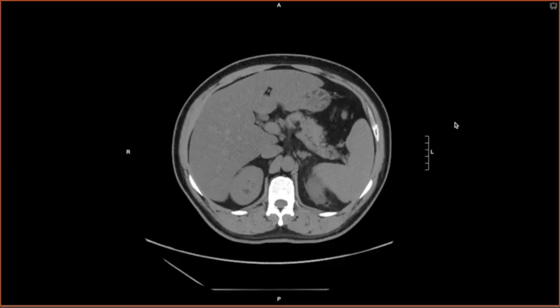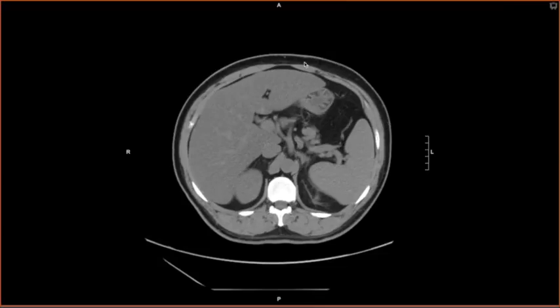Okay, so now let's move back to talking about the basic radiographic densities, Hounsfield units, and then we'll talk about some clinically important applications of Hounsfield units. This is a CT abdomen without contrast, where we can actually see all the basic radiographic densities. We have fat out here, that's darker. We have air out here, that's even darker. We have soft tissues in the spleen, in the liver, in these muscles along the abdominal wall. We have bone here as well.